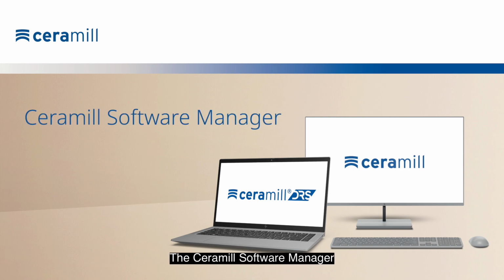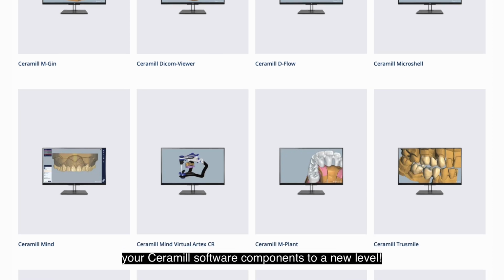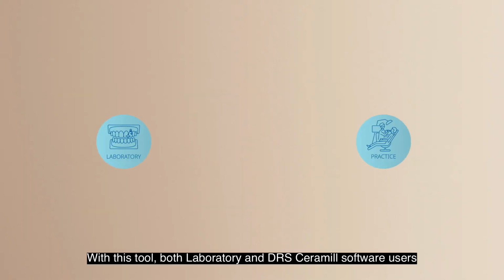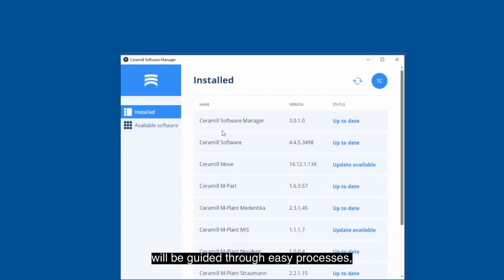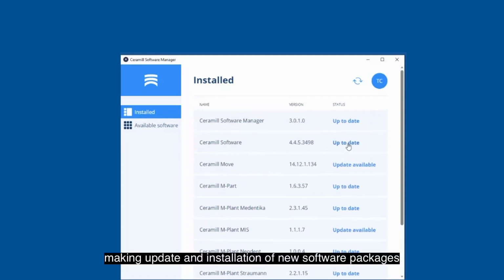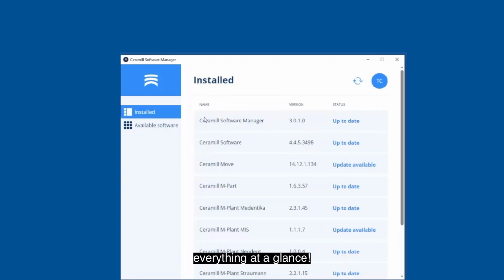The Ceramill Software Manager takes the installation and update processes of your Ceramill software components to a new level. With this tool, both laboratory and DRS Ceramill software users will be guided through easy processes, making update and installation of new software packages as easy as child's play, everything at a glance.